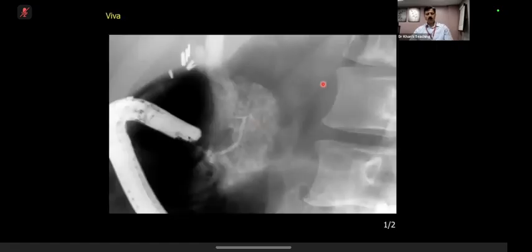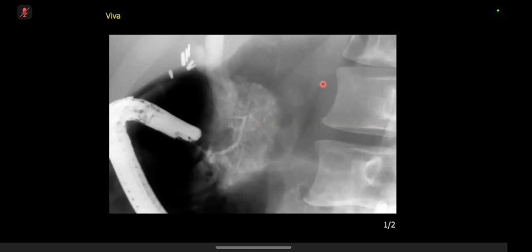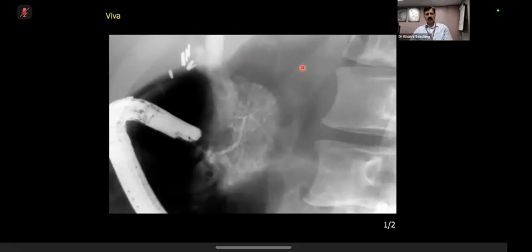Over to you. Okay, this is an ERCP image with contrast filling the pancreatic duct. I can see evidence of surgical clips, possibly resembling cholecystectomy. So this is unrelated, and I'm not interested. All right. So I cannot see the body or tail of pancreas. Excellent. Well done.